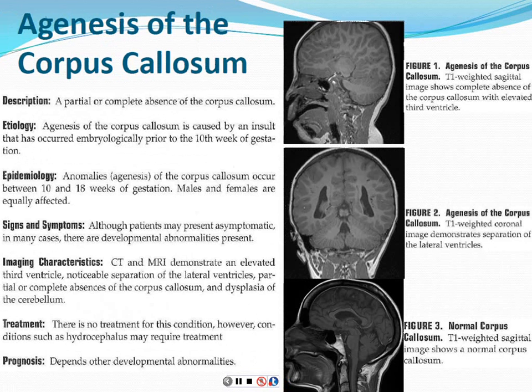This is a congenital anomaly, agenesis of the corpus callosum. This is another one of those things that happens in the embryologic stage, where everything has to happen exactly perfectly, or you can get anomalies later on. The corpus callosum is the joining of the white tracts from across the midline, and what you see in a normal patient is this little gray structure here on your first sequence, the T1 sagittal image.